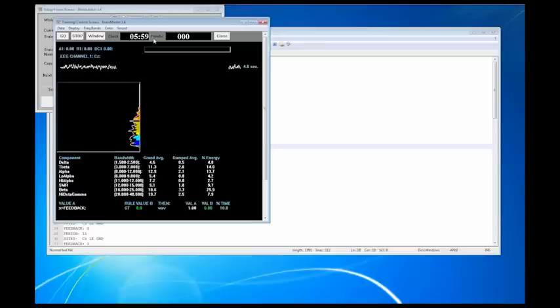Now we're going to watch this clock and see it turn to 15 seconds or 5:45. That's when we're going to see feedback get turned off. All right, there it is. So as you can see, duty can control how long a specific item is held.